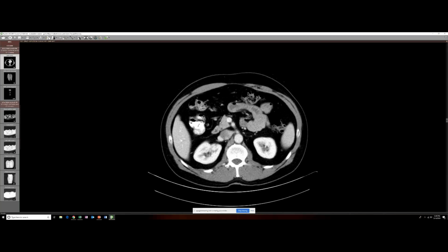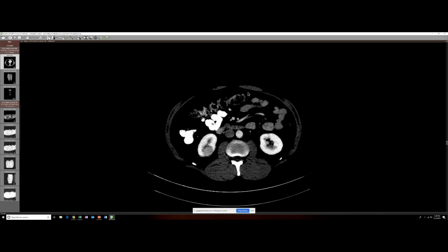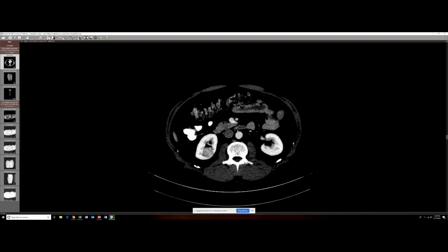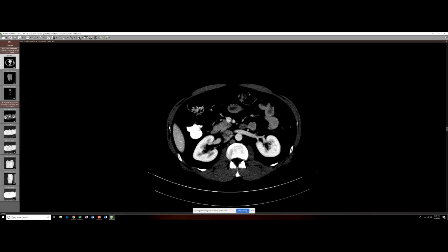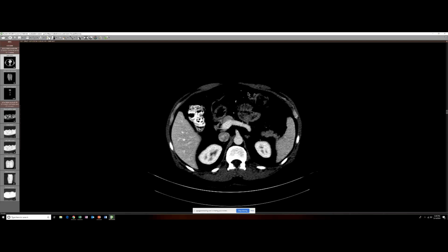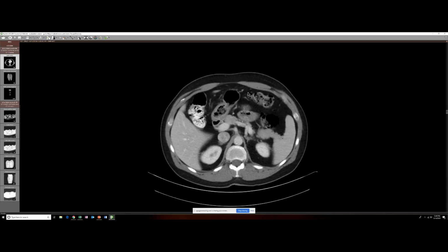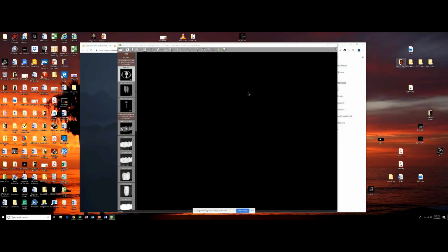And then the other nice thing he also has is this renal cell carcinoma, which was a chromophobe renal cell carcinoma. So the case of Birt-Hogg-Dubé. I tried to do a MIP to see if I could see the fibrofolliculomas on the skin, but I couldn't see them, and supposedly they're very small on him.